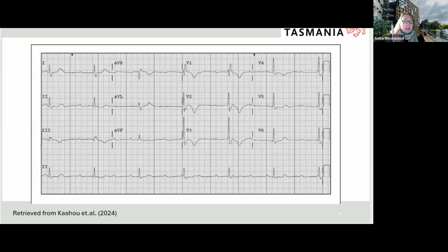So therefore you've got upstairs in the atria having a party, it's firing regularly, but because you've got complete AV block, it's not getting through to the AV junction. But it's interesting that the QRS is, so it must be a high up block because that QRS is quite narrow. It's not broad. Yep, absolutely. Is that what you're thinking? Yeah, so it must, 100%. Be near that, or up near the His. I'd imagine that's happening. Yep, agreed.